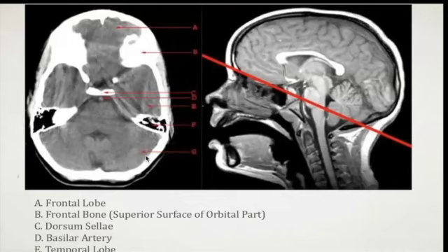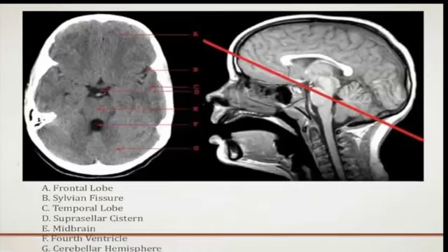And below here we have G. So can someone tell me, looking at the red line here, should G be the occipital lobe or the cerebellum? Any idea? Cerebellum, perfect. So we're looking at the cerebellum. Thank you to people who responded on the mic and people who responded on the chat box. So let's proceed from here.